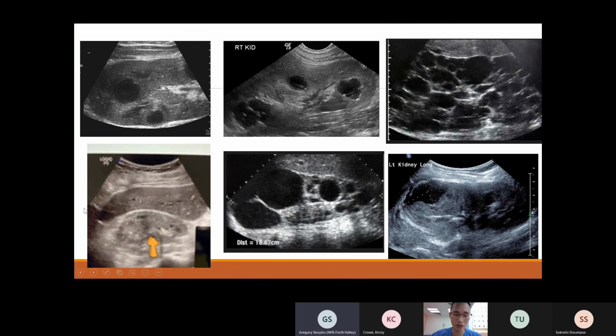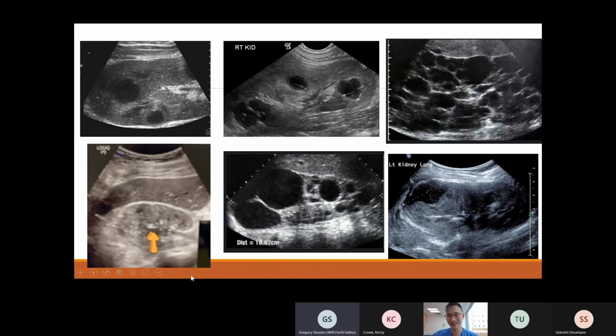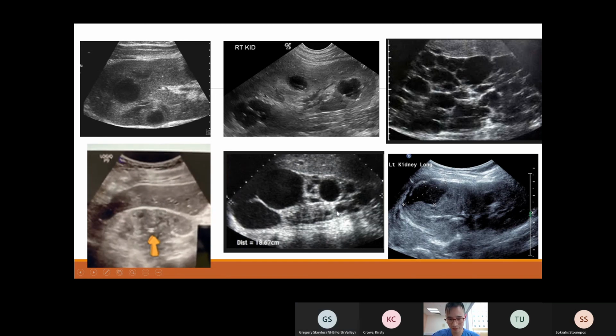Sorry, this image, Greg, is not your fault. This is just a very blurry image, and this was a challenging one. Sorry, I chose you for that. Apologies. No worries. Greg, what else have you? Do you want to have a bash at this picture?